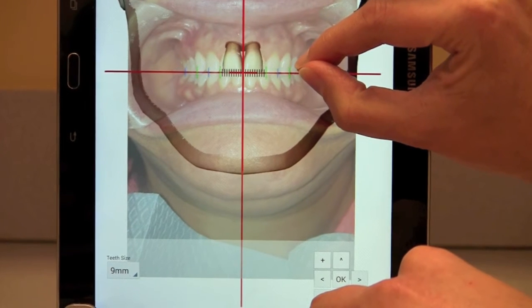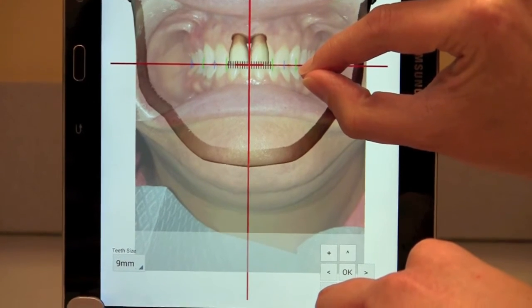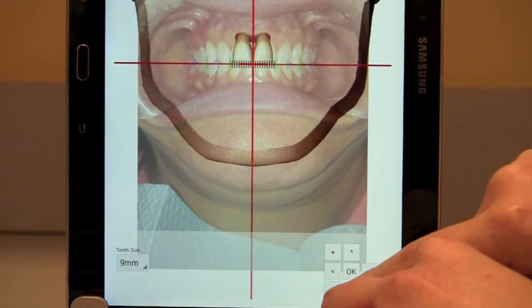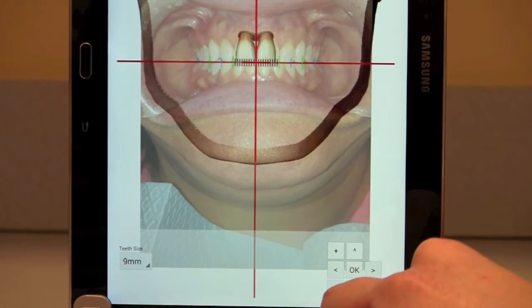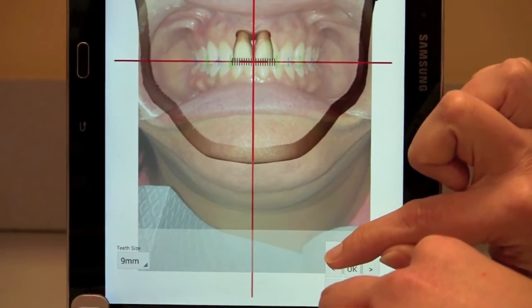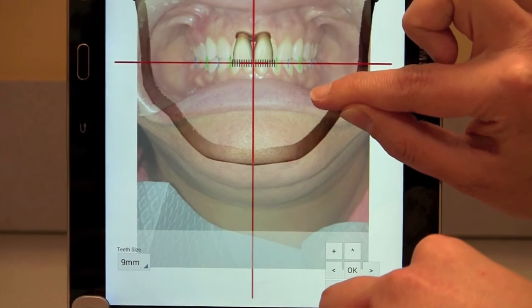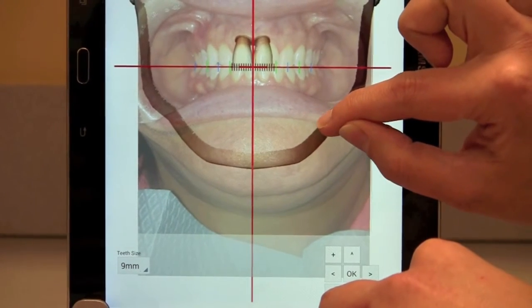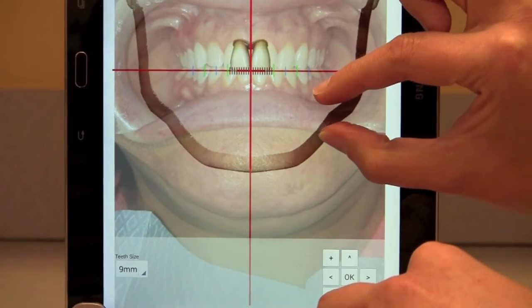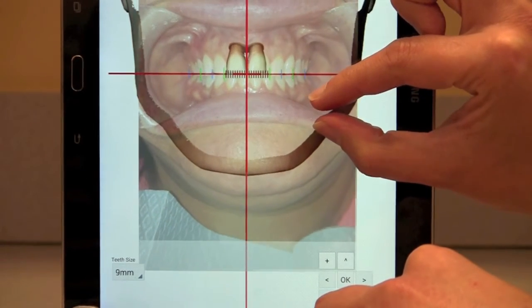And now as we get close, and we have a little fine-tuning to do, I want to bring your attention to the bottom right. You're going to see a plus and a minus. The plus and minus will make the width wider or smaller, and then we can use the arrow keys to fine-tune, move around the T. Again, the critical portion of this part is making sure that the centrals are lined up, and that they're flat on that horizontal bar. I can get there. Boom.